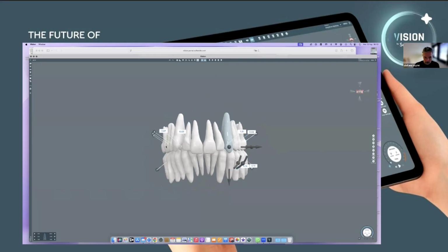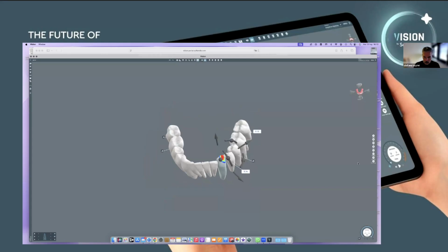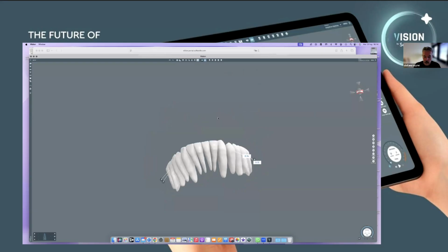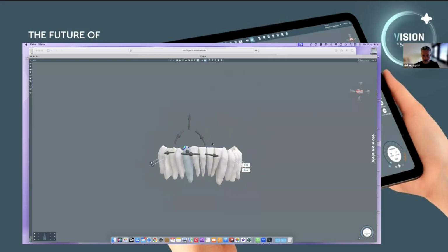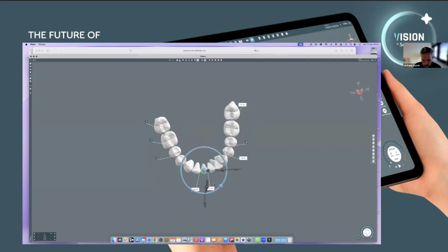Like to have open here a little bit like this. Oh, sorry. Here, everything. And now I go in the lower just to check this one. I want to adjust canine and jaw and look at the overjet, overbite, and the curve of Spee is a little bit down, and you need to align this one a little bit. Let me check some alignments.